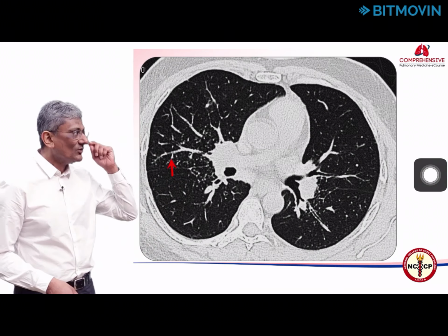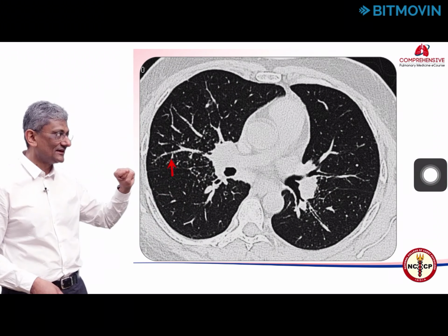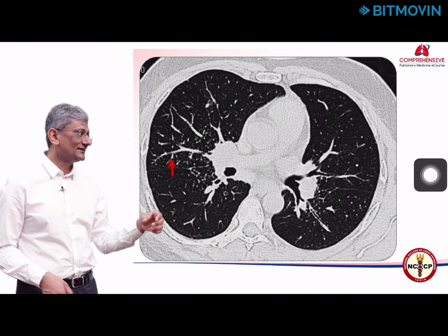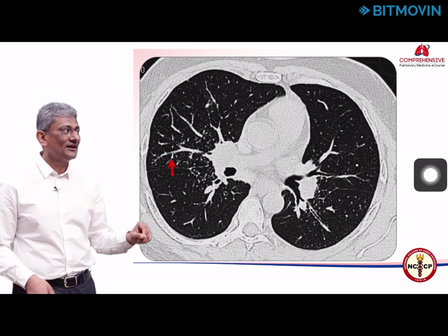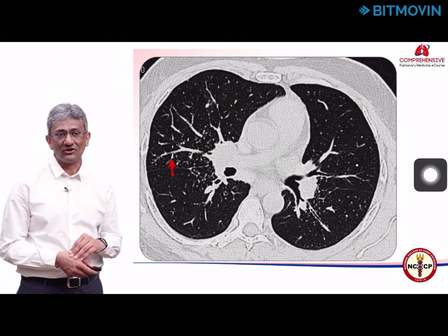Here you can see a patient where one of the vessels shows perivascular beading, and we have marked that with the red arrow, and the rest of the nodules are arranged around the right hilum. If you see carefully, even on the left in the infrahilar region around the pulmonary artery, we can see some nodules.